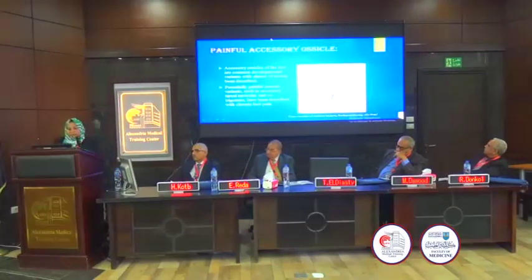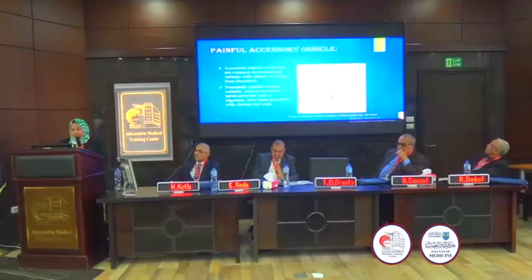Now we move to the painful accessory ossicles, and as we saw in a previous lecture from Dr. Mark, we have a lot of accessory ossicles. Of course, not all of them could be symptomatic. Many of them are asymptomatic, but sometimes because of instability of the synchondroses, which intervene between the accessory ossicle and the parent bone, this creates pathological findings and causes the patient's symptoms.